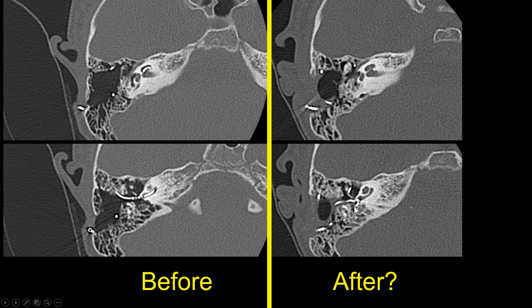This patient was actually playing with the cochlear implant subcutaneous leads in their skin, and after a while they were twirling it, sometimes called twiddler syndrome, which may happen with cardiac pacemaker wires, where the pacemaker may be twirled in the chest and the pacemaker leads will be retracted. This case similarly had retraction of those leads, which are now looping into the middle ear, and they were pulled out of the round window a few years after the study where we saw the leads nicely in the basal turn previously.